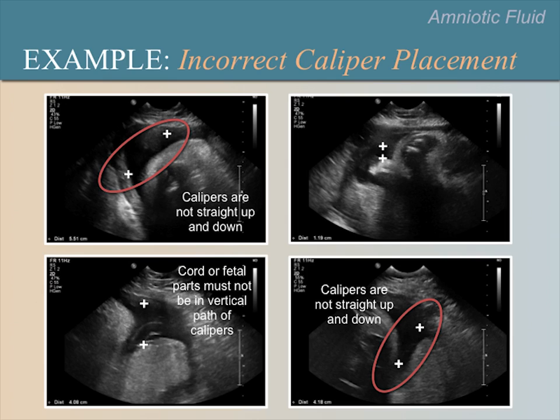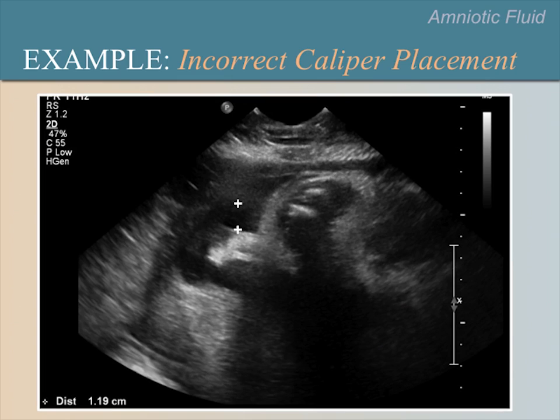is smaller than it should be. Let's study this image more closely to determine why this caliper might have been placed too low. We have now enlarged the image. Look just anterior to the top caliper, and you will see a hazy or fuzzy cloud that blurs the true edge of the uterus. Here we have outlined this cloud, which is an artifact and is not really there.